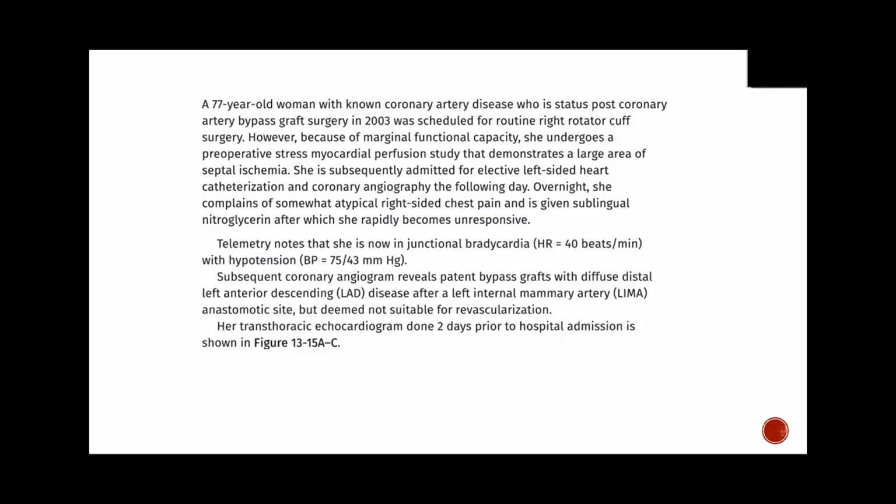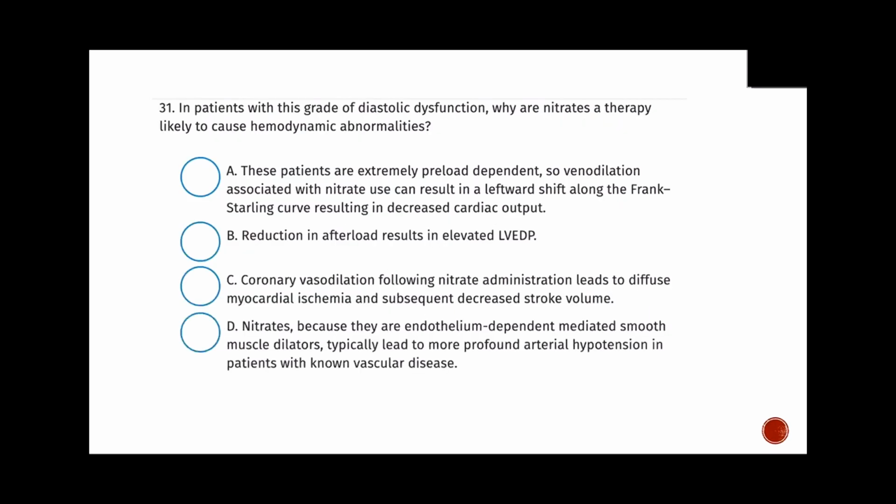So let's say this patient, what do we think about this patient? This patient has what looks like advanced diastolic dysfunction, right? Based on the history that we're seeing. So why do patients with advanced diastolic dysfunction often get hypotensive with nitrates? Because they're preload dependent, 100%.